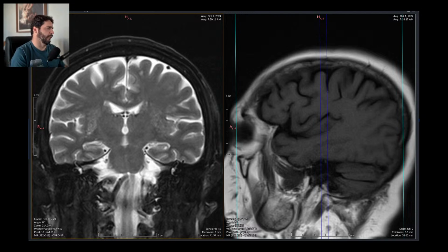Just add a few features to this report. Oh, sleepy. I'm going to add my template of MTA2, hippocampus classification. Why not? It is what it is.